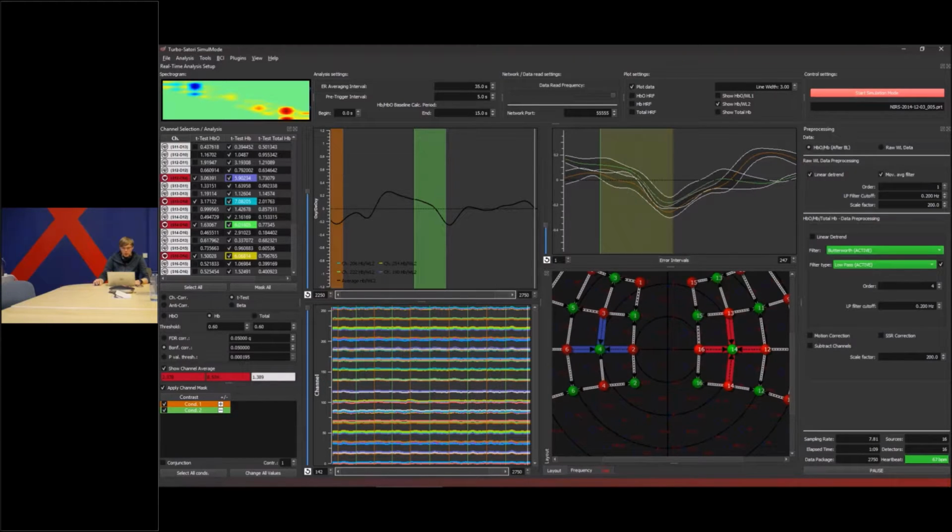With this, you are able to create a channel which is just the average of multiples, which can also be an option for later neurofeedback or BCI applications. And this is true again for oxy, deoxy, and for total. So these change the statistics accordingly to these signals.